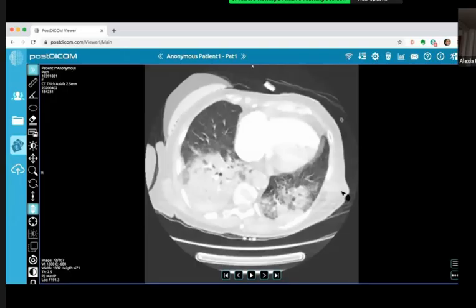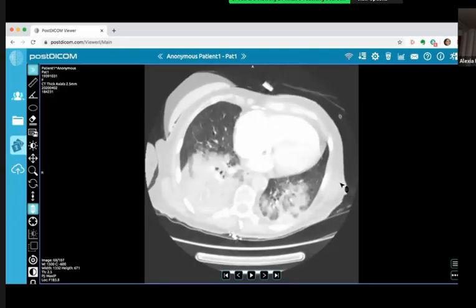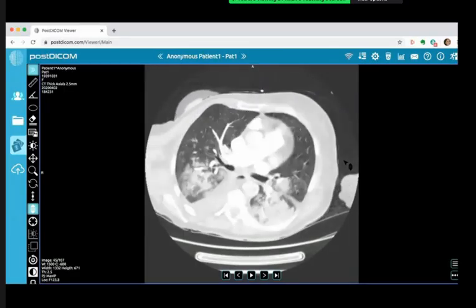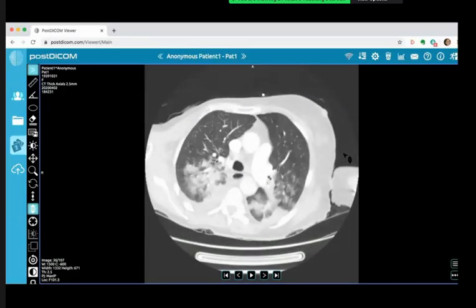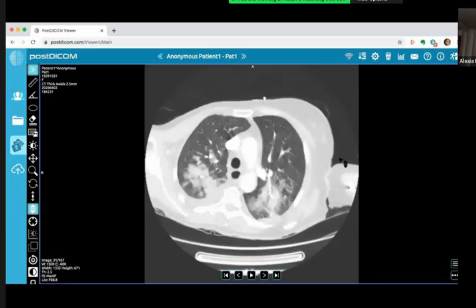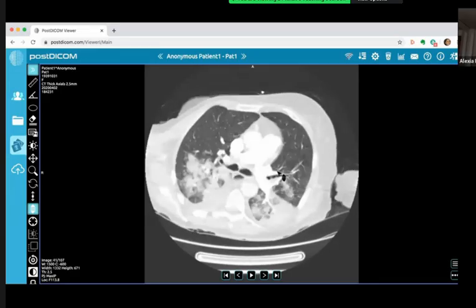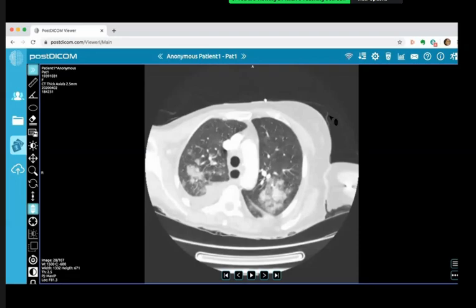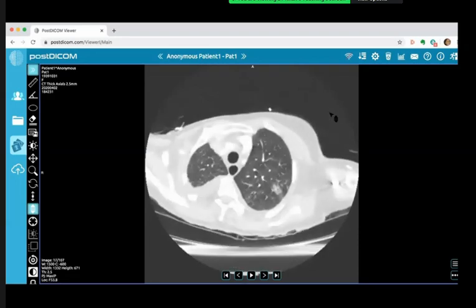She's just had surgery. She's in theatre recovery. Yeah, the history is not in keeping with PE. Also, if you window accordingly, there was no PE. I agree. So this is a very short or immediate post-operative sequela, right?